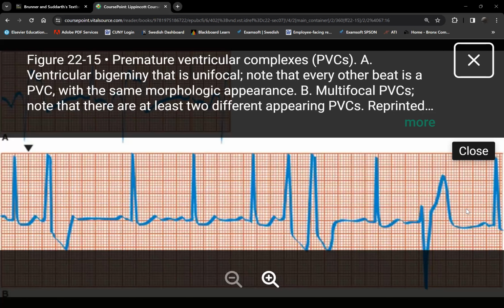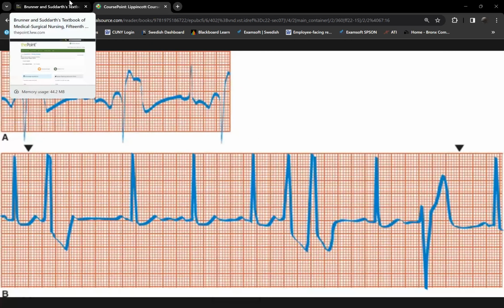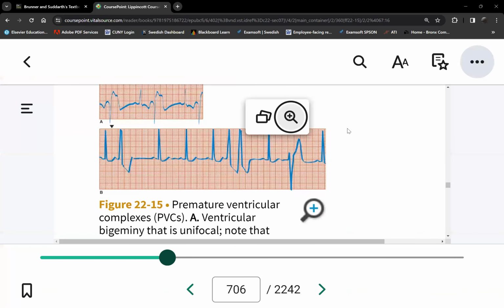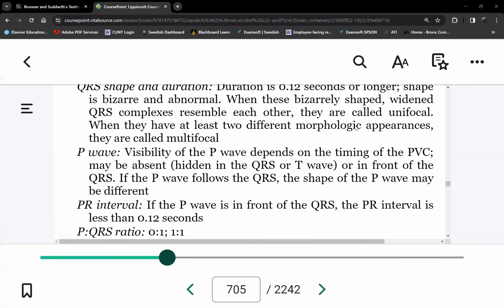You follow? Okay, so there are different patterns here, and then I'll ask you questions to see if you can have a try at what type. If you look at figure A, you have a normal beat here, followed by a distorted one, right? Normal and then another distorted one. So the pattern is every other, correct? You have a sinus and then a PVC, sinus, PVC. So that's what we call a bigeminy because it's every other beat.